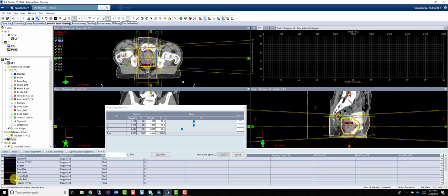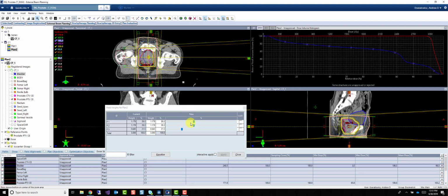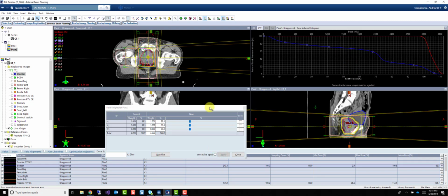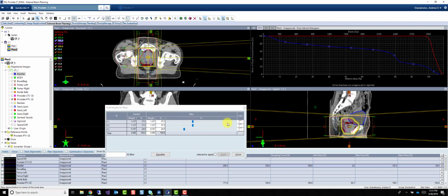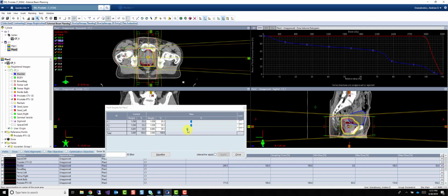You can also see this on a DVH. So if I drag this up, make our weights equal, then drag it back down, you can see how that changes our DVH. So you can kind of play with that weighting in order to get the plan to look how you would want to. So let's say our goal is to keep that 80% line pretty conformal.